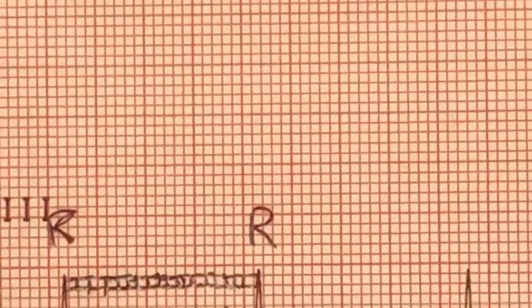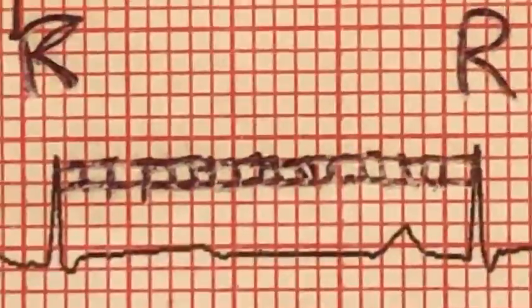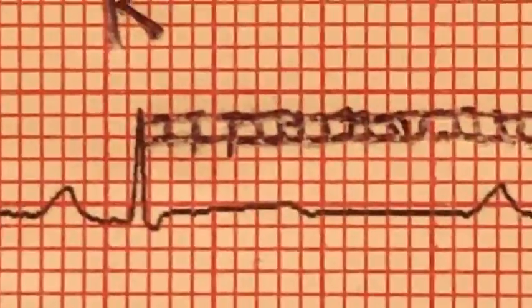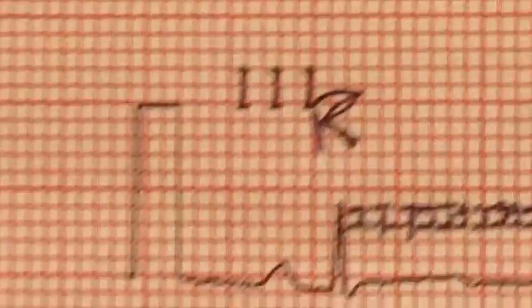Down here on this one, it's kind of hard to see. Get a little bit closer. There are tiny little boxes in between each R. Sometimes we have to get a magnifying glass to see them very well. But this is called the 1500 rule.